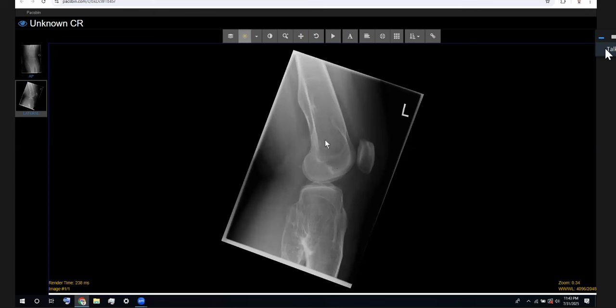So multiple outgrowths are seen in the posterior aspect of the femur and along the tibia and fibula as well. There is a small fibula. So this is in keeping with multiple osteochondromatosis. I'll ask the patient about symptoms.